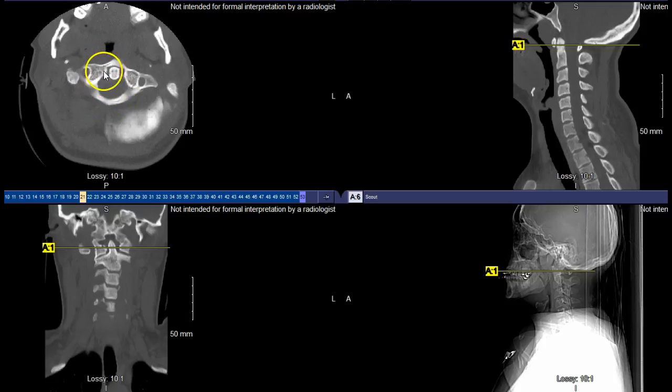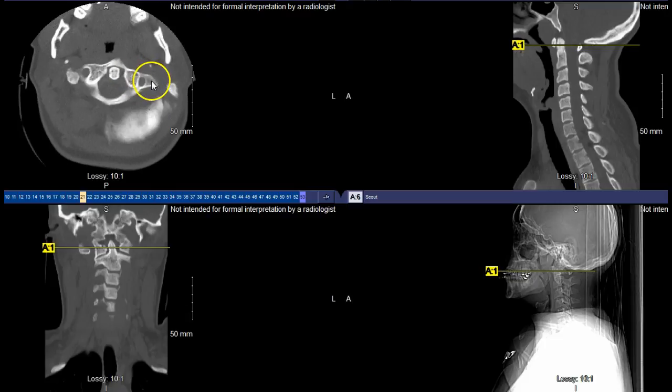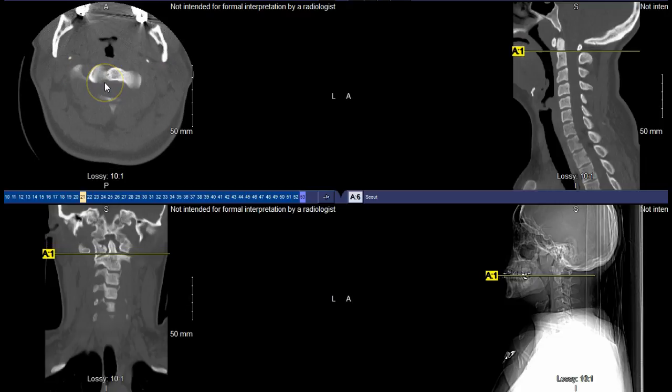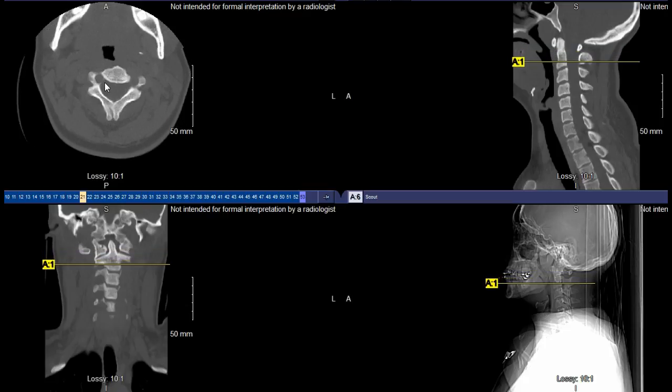So really a great anatomical image based on the structures that we've kind of emphasized before, because you can see those arches and you can clearly delineate where that transverse foramina is and where it's at respectively on this side. Additionally, you can kind of see where the structures of the lateral masses are as well, transverse processes respectively. As we continue to kind of go more and more inferior, you'll be able to see some of those traditional characteristics of that cervical spine.